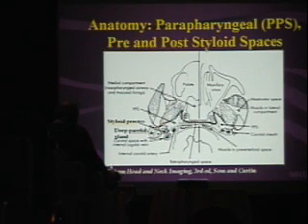Now, what if you're in this anterior, pre-styloid or pre-vascular space? Well, in this pre-styloid parapharyngeal space, there's only 2 things that live: fat and salivary tissue. Deep lobe of the parotid gland, small salivary rest cells. So if you were to see a lesion right up here in the nasopharynx, in front of the carotid sheath, in front of the styloid process, it's pretty much always a salivary lesion. Just based on location, that should certainly be your first thought. And so that's the type of assessment you're trying to do based on this anatomy.